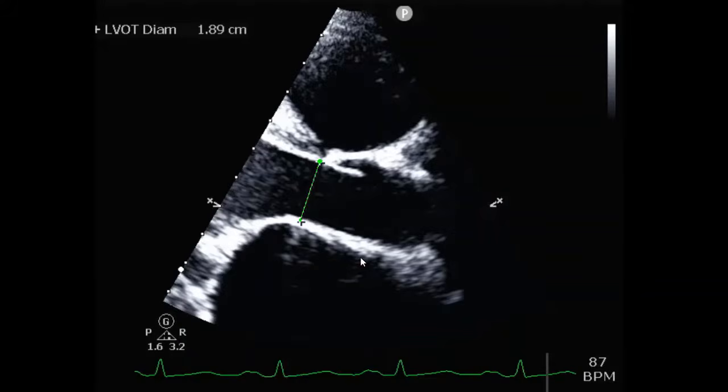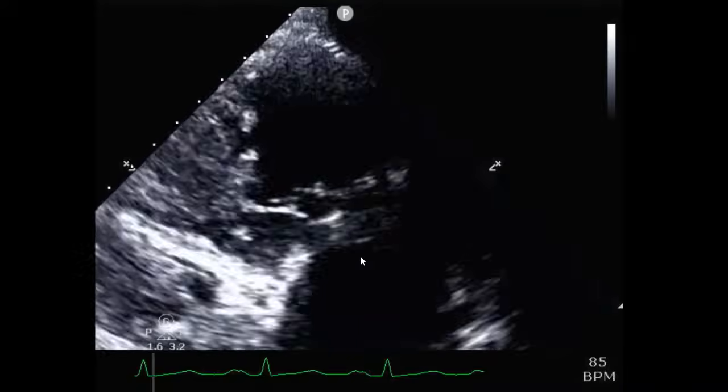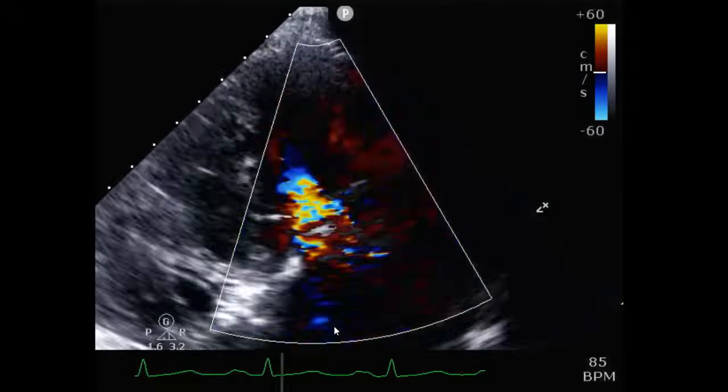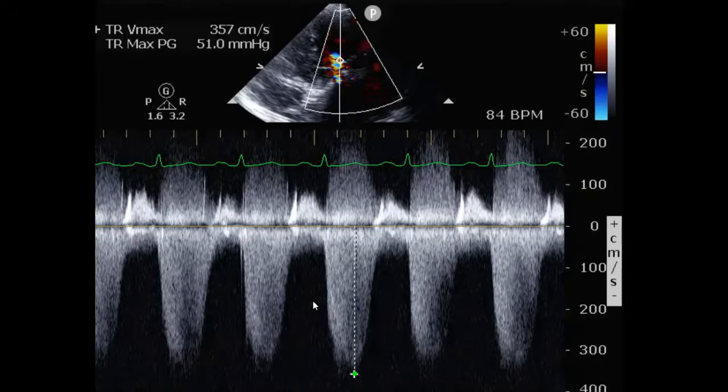Another thing to look at in the case of a mitral regurgitation study is the severity of the tricuspid regurgitation, and also to estimate what your pulmonary pressures are. This is the RV tilt view with the right ventricle up on top and the RA here on the bottom. You can see a fairly significant tricuspid regurgitation jet, the full extent of which we don't really see. We get the sense that it's not a truly severe tricuspid regurgitation jet given its parabolic rather than triangular shape.